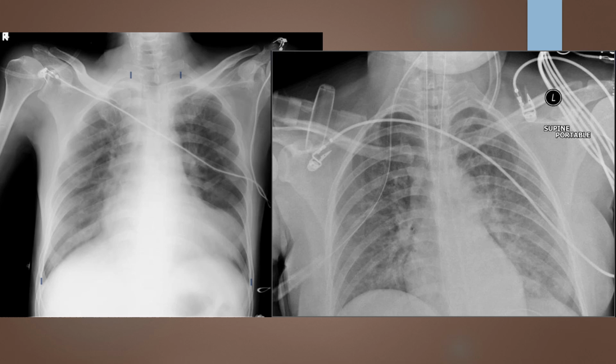So now we're going to start looking at our technique. So do I have good bony trabecular pattern, soft tissue detail, cortical outlines? And I would say in this particular case, I'm lacking penetration. I am not getting any cortical detail of the thoracic spine. I have excessive brightness. I have a pretty good grayscale, but to me, this looks like I have an issue with penetration. So I'm going to increase my KVP 15% and probably repeat this image. But before I repeat the image, I want to make sure that there's nothing else that I need to change.